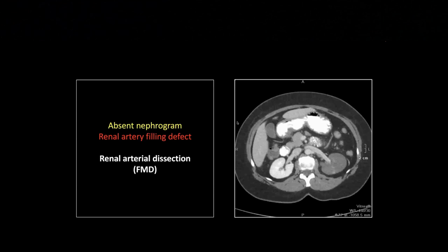All right, this one is very interesting, and I missed this finding. Honestly, it's pretty tough, but I did not miss the hypodensity of the left kidney. Clearly, the whole left kidney is just out. And if you look at the left renal artery, there it is. And it also is occluded, right? There is hypodense filling defect there, suggestive of a thrombus.